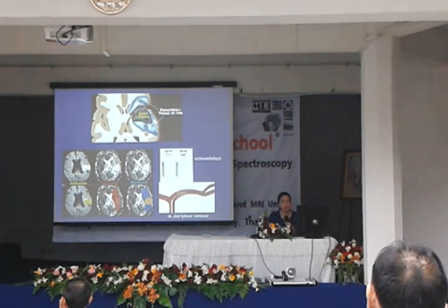In perfusion imaging, the goal is to detect the tissue at risk, that we call penumbra. This area of the brain can return back to normal. Then we combine the perfusion and diffusion images to look for the penumbra zone.